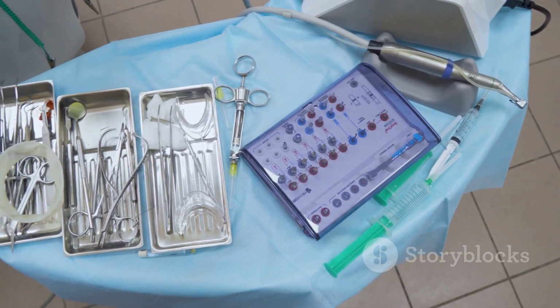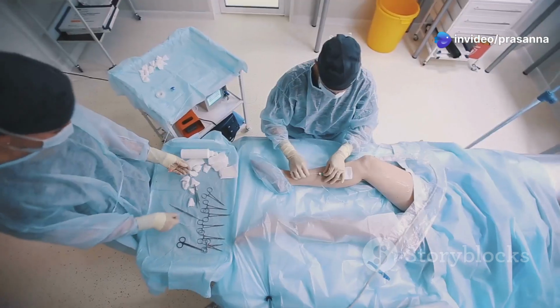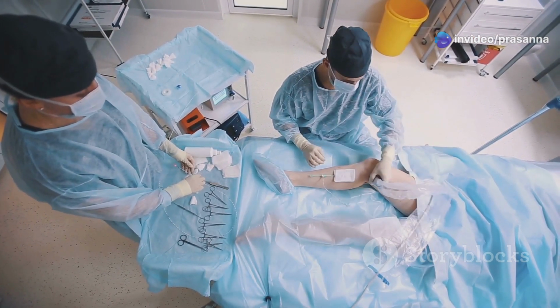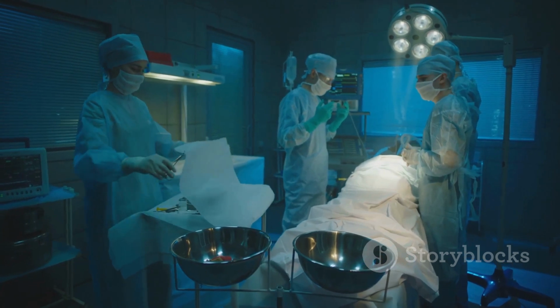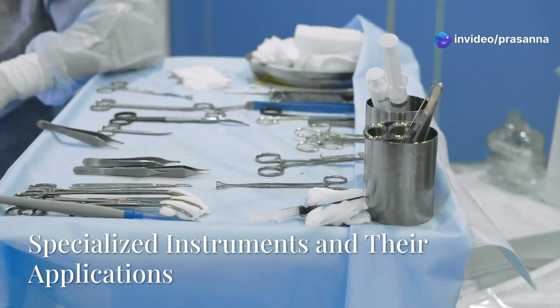Maintaining the sterility of surgical instruments is a paramount concern in every operating room. Surgical teams follow strict protocols for handling and sterilizing instruments, ensuring patient safety and minimizing the risk of infection. This meticulous attention to detail underscores the critical importance of sterility in the surgical environment.